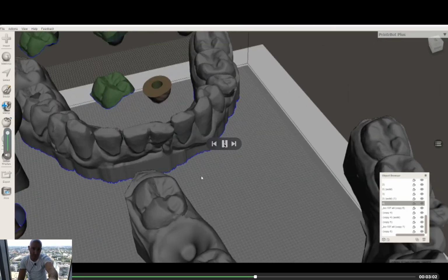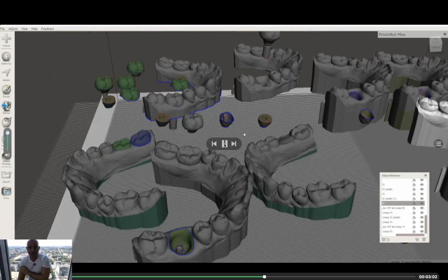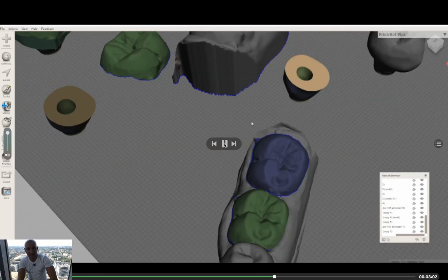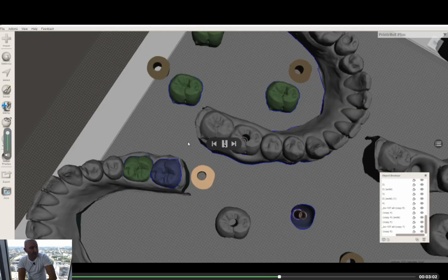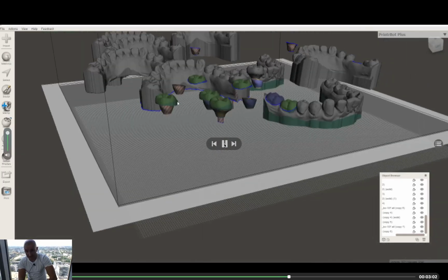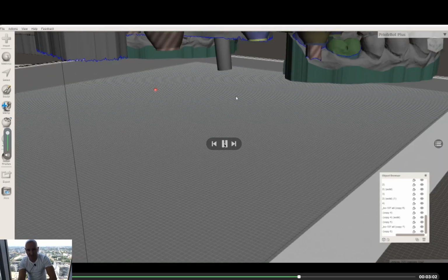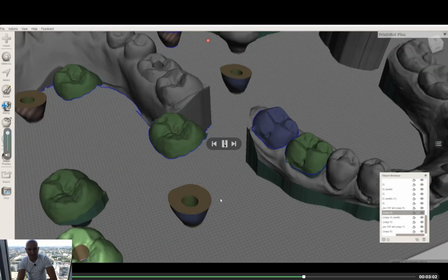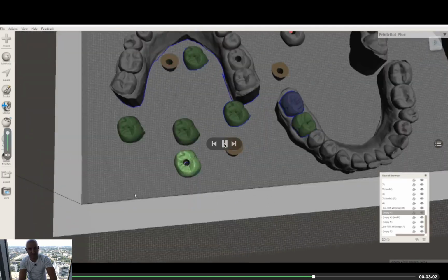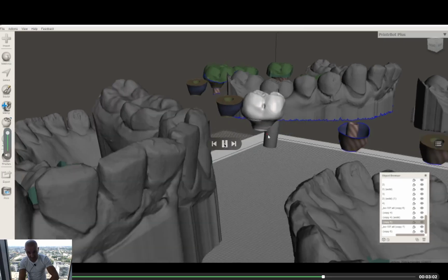And what is my aim here? To show you how you are able to do it by using only simple functions of this software. So yes, in my everyday practice I do not use Meshmixer, so I am not a master of Meshmixer, but I want to show you that it is not hard, because even a guy like me who does not work with Meshmixer every day is able to do it like this.